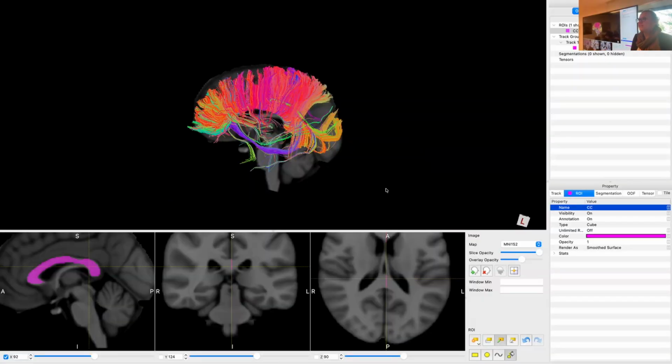Now, the beauty here is if you do crash, you can reopen the scene and it will bring you right back to where you crashed. So ideally, you're not falling behind. Okay. So we all saved. We renamed our region to CC. Now we need a second region that's an exclusion region. And I already said that ideally you want to be perpendicular to the regions that you draw. Now, obviously, that's a little bit tricky here.